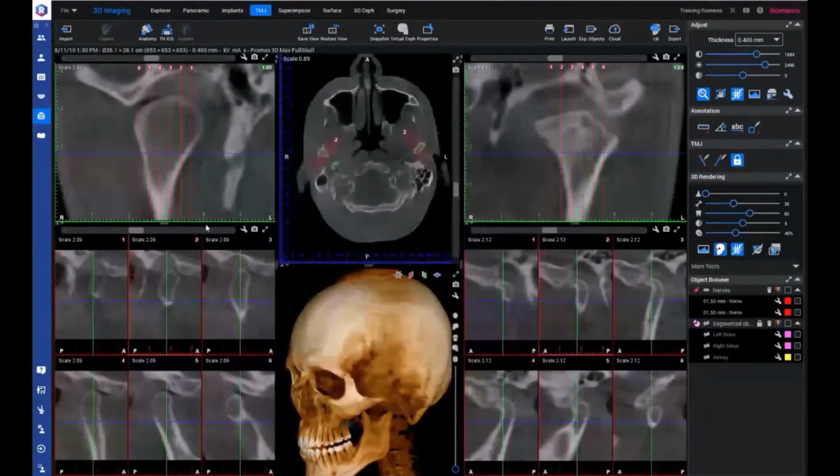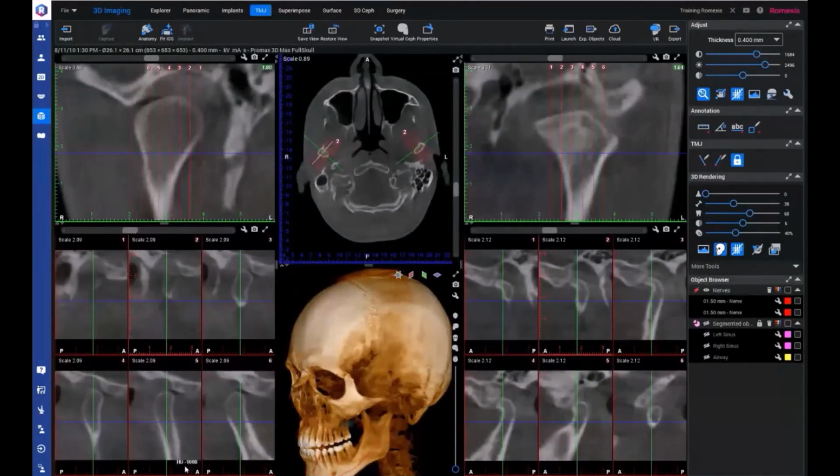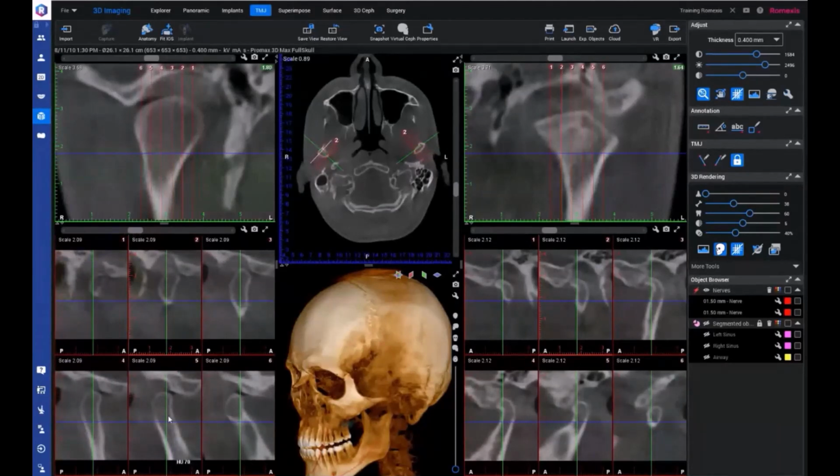But a very nice way, and then you can of course adjust more also what we see in red here, the cross-sectional slices. And then of course do measurements or take the snapshots directly from here, just like we have seen in the previous steps as well. So one more thing that really saves a lot of clicks from the user now that we are able to do all of this with the AI.